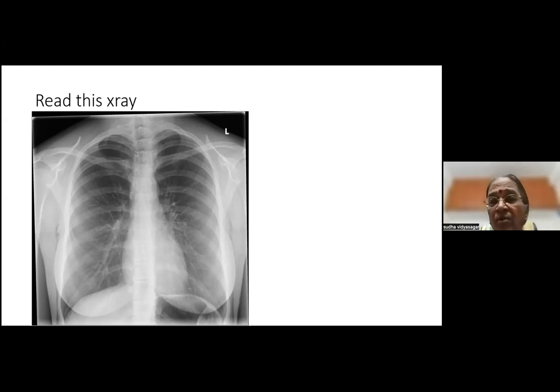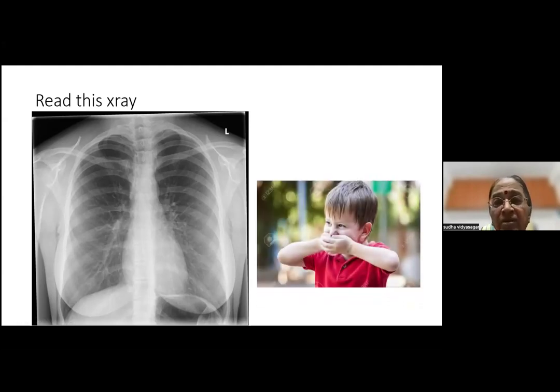When an X-ray looks near normal to you and somebody is asking you, is something wrong with this X-ray? Please remember there must be something wrong. And a mistake that people often make is to call that a pneumothorax. That is not a pneumothorax. It's a breast shadow and the diaphragm. It looks equal on both sides. So don't overread an X-ray in any way. But don't miss a small cervical rib which is looking at you right at the top. So get into the habit of going in an order so that you don't miss small things. Why is this thing not moving? Yeah. So that's what we feel when we have missed a small thing on an X-ray.